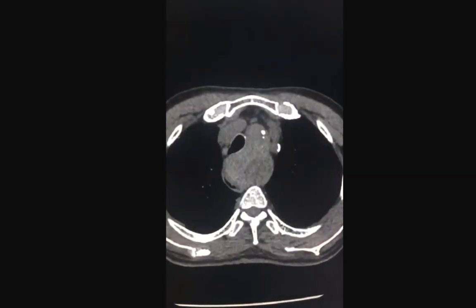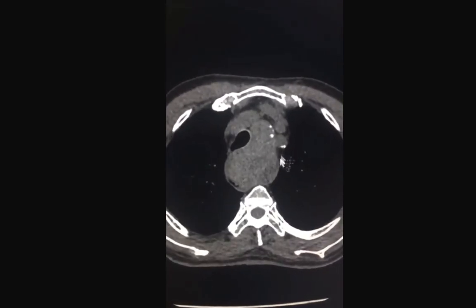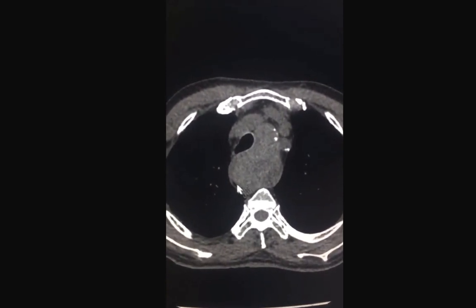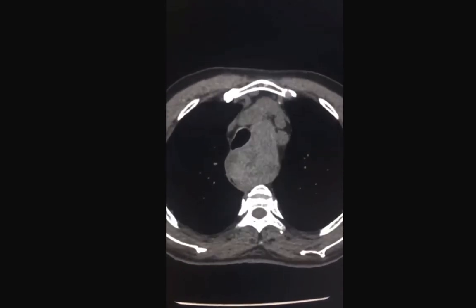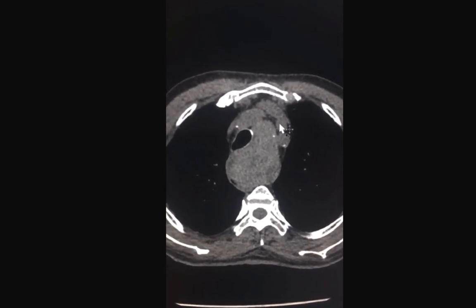the same attenuation and calcifications. The abnormality also shows extension into the chest in a retrotracheal location, severely compressing the esophagus. For the seniors with such an abnormality, don't forget to comment on the effect on the airway, on the esophagus, on the adjacent vascular structures.